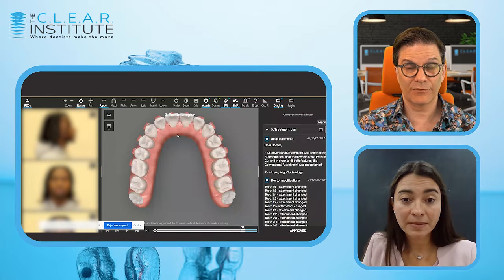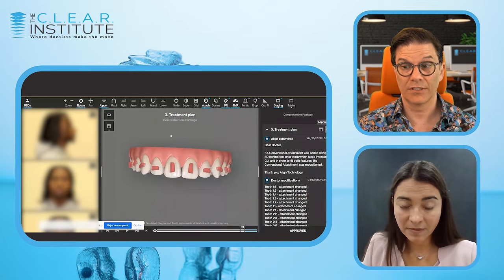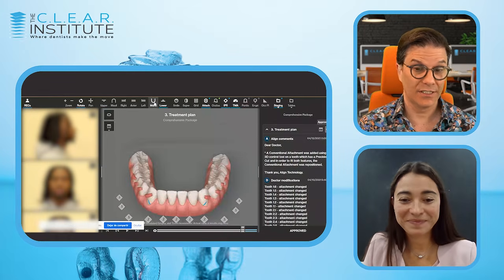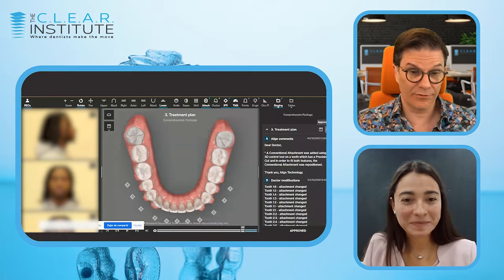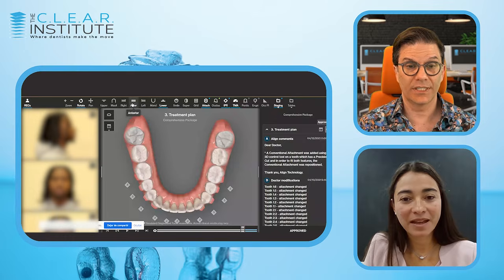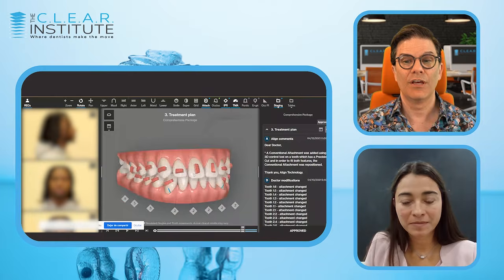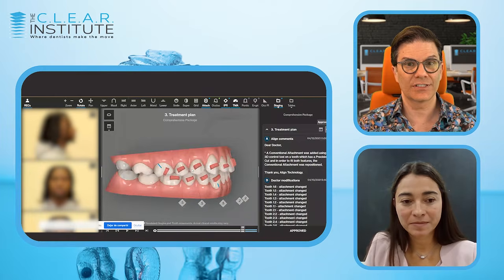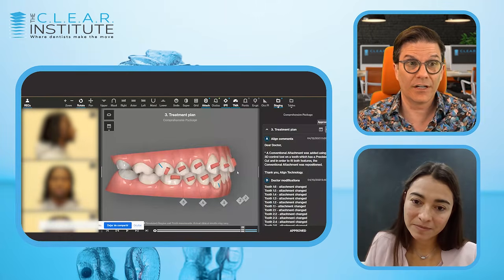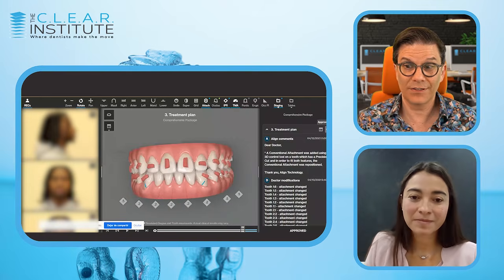In a case like this, my preference would be to have both retention. I say sometimes suspenders and a belt, both. Exactly. You have the lingual wire and a vacuum form or an Invisalign retainer, Vivera, whatever, over it, because those spaces have a tendency to reopen very fast, and your patients, in a case like Andrew's, where the chief complaint is the space between the two front teeth.